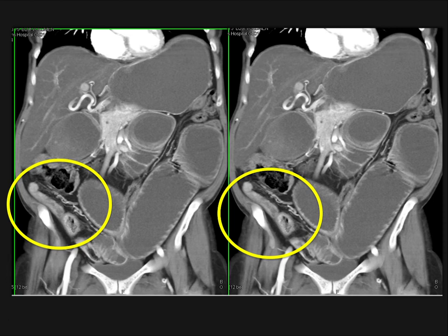So again, I think in terms of obstruction, we could say exactly where the obstruction is, but we couldn't tell at times the disease activity. And surely whether it's a tumor on top of inflammation, it can be tricky. But we're really good at looking at the presence or absence of obstruction, the location of obstruction, and many times being more specific as to etiology.